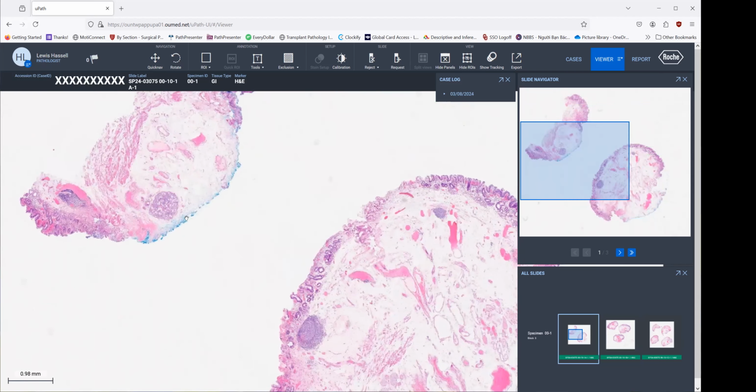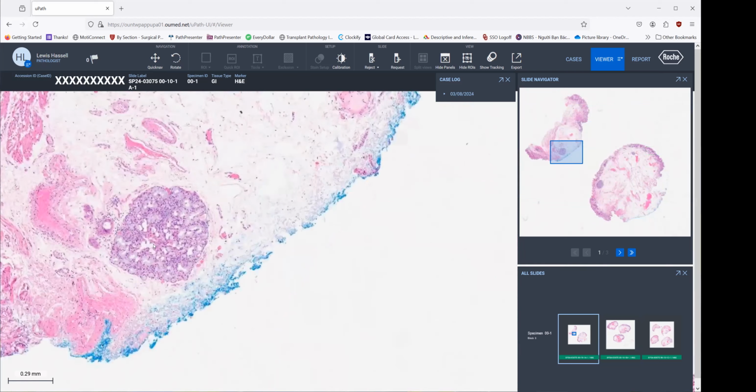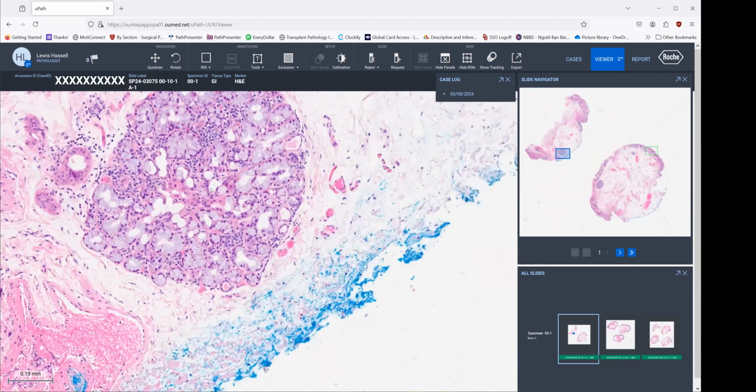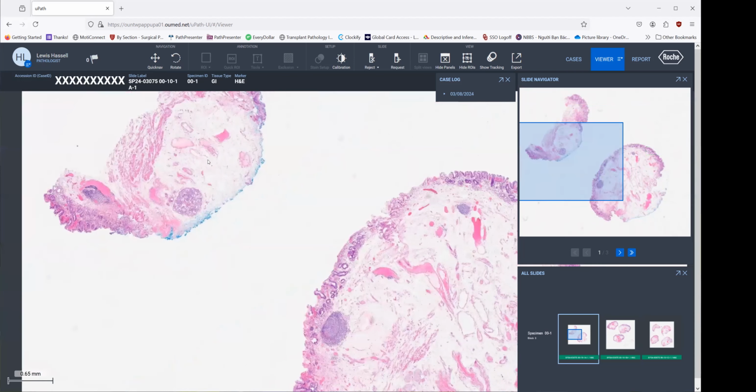Now, sometimes what happens is that they see other things that they think may be neoplastic. So, for example, submucosal esophageal glands like this will sometimes be large enough that they're visible as a little bump in the esophagus. And so those areas tend to be resected in somebody who has Barrett's esophagus.